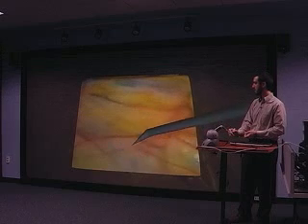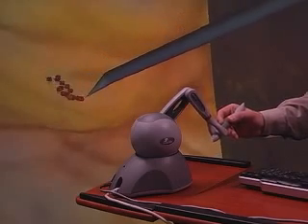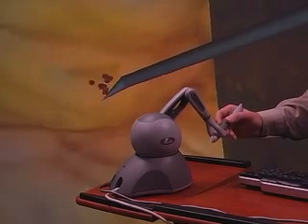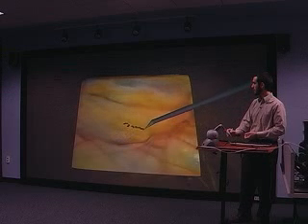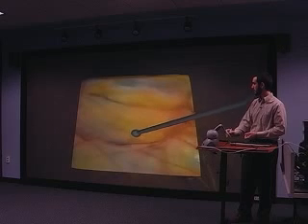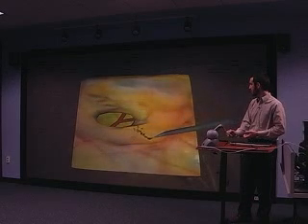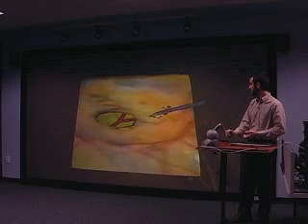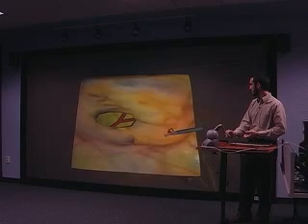So I'm going to use the cautery tool to cut away at the mesh a little bit, or cut through the organ. And you can see it makes a dent here. And then we can also poke around at this dent that we've made. So continue to cut and see what we can find to remove more of the flesh.